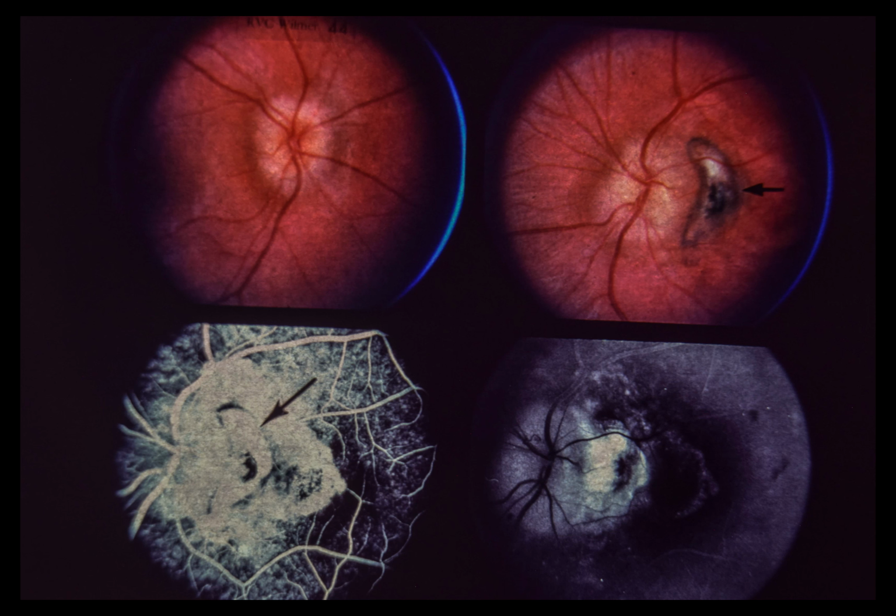A pigmented lesion is present in the papillomacular bundle, and the retinal pigment epithelium in the macula is atrophic. Lower left. A fluorescein angiogram shows that the pigmented lesion in the papillomacular bundle represents a subretinal neovascular membrane. The hyperfluorescence in the center of the macula represents increased transmission of choroidal fluorescence through an area of retinal pigment epithelial atrophy. The pigment epithelium has lost its pigment due to long-standing detachment of sensory retina.